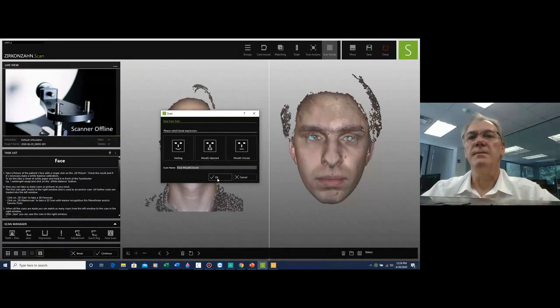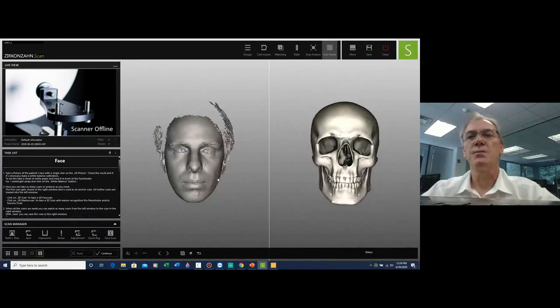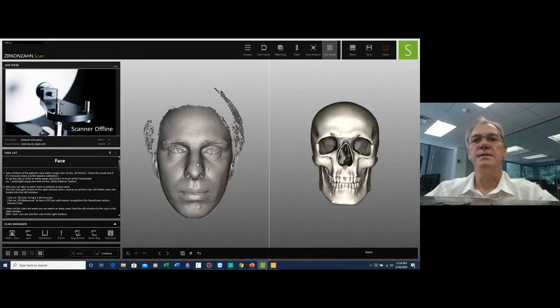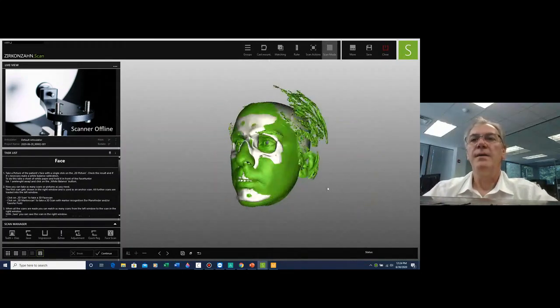So automatically the computer, by selecting these elements, we'll name the file. We'll say OK. And at this point, we need to define an orientation. The skull has got nothing to do with this patient. It's just there telling us which is the front and which is the back. And this is what we need to tell the computer. This is the front part of this patient. It doesn't really matter where you put the dots, but now we have the orientation.